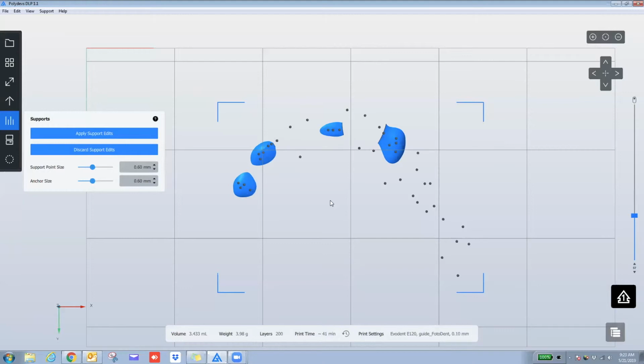The amount of supports that you need is not an exact number. If at first you're unsure, my rule of thumb is add a support. To me, it's easier to take off 1 or 2 extra supports than it is to go back and have to reprint a surgical guide that was unsuccessful.